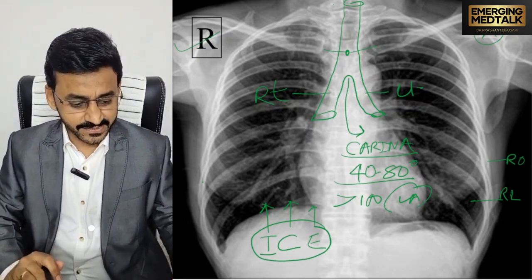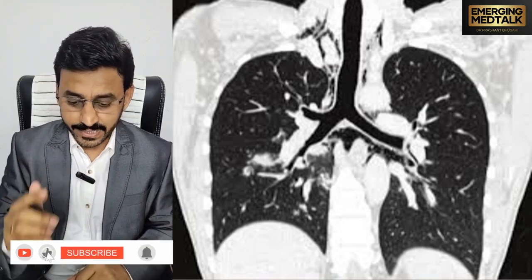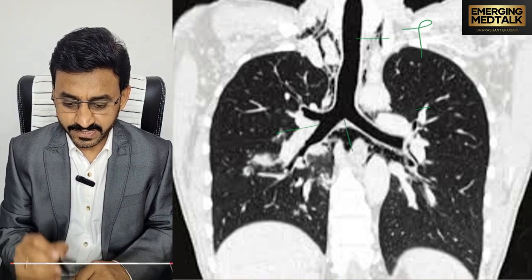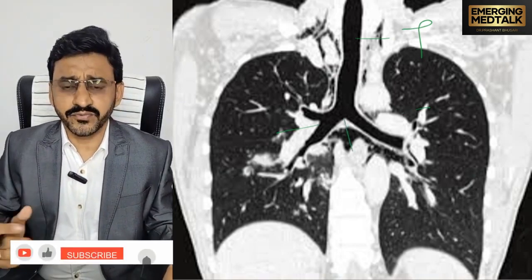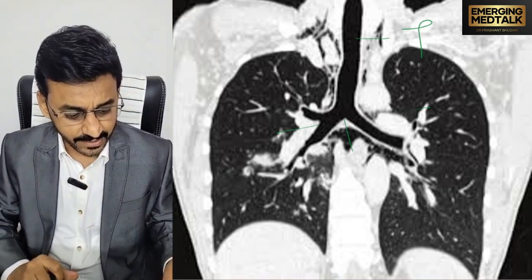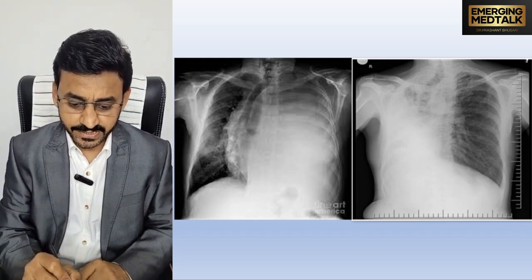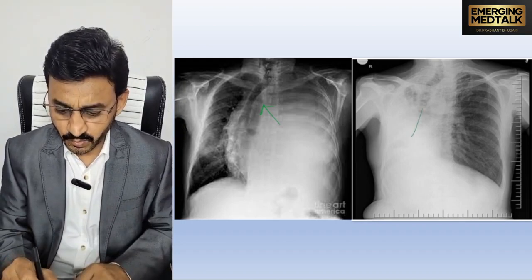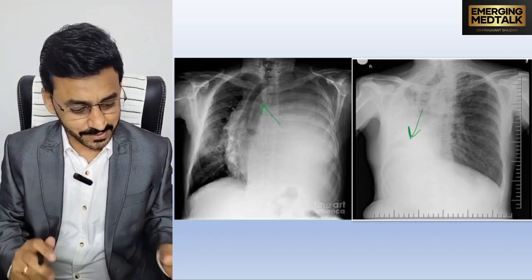So we will see this airway here. We can compare it on the CT image and easily see the trachea. This is the right principal bronchus, left principal bronchus, and the carina. It is midline and around 10 to 12 centimeters in length, and in the neonate, the newborn, it may be around 4 to 5 centimeters. It may be pushed to the opposite side, as in pleural effusion, and it is pulled towards the same side in volume loss, that is collapse of the lung.